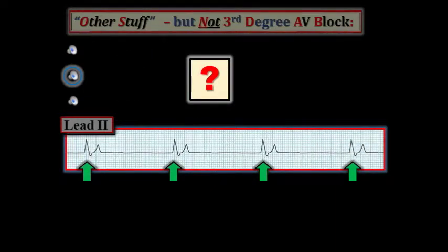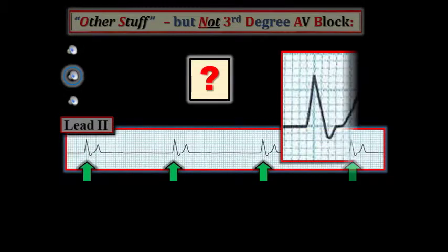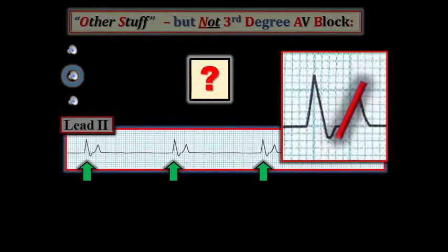What if instead we change the appearance of this rhythm a little bit and tell you that the patient is on dialysis? The main difference we see relates to the presence of tall peaked T waves, which in a patient on dialysis strongly suggests there is hyperkalemia.